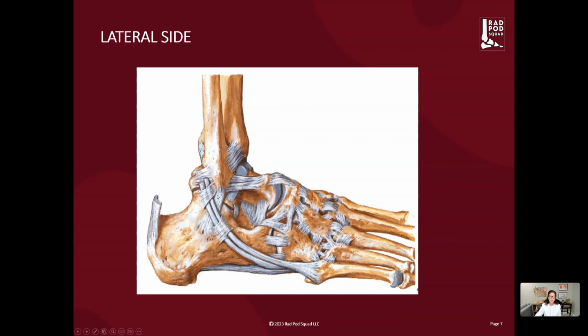We are not appreciating the band of the arcuate fibers that join it to the calcaneofibular ligament, which is seen here. And we're seeing a piece of the superior peroneal retinaculum that the peroneal tendons are restrained by. We can furthermore see the inferior peroneal retinaculum as the peroneal tendons move down the line, and these retinacula are very important for keeping our peroneal tendons secured to our calcaneus.